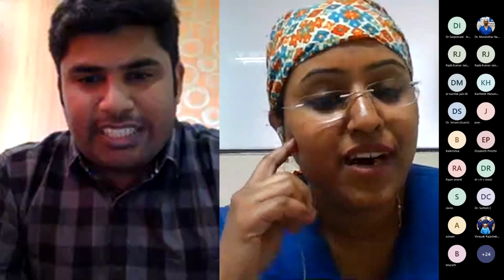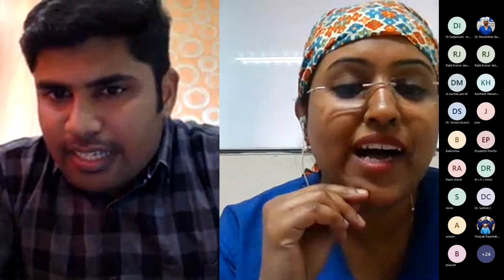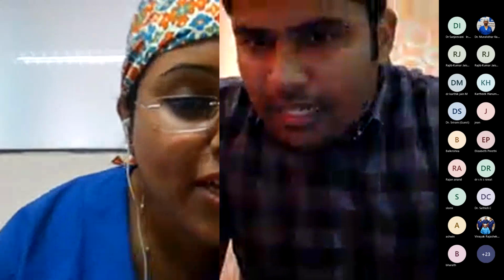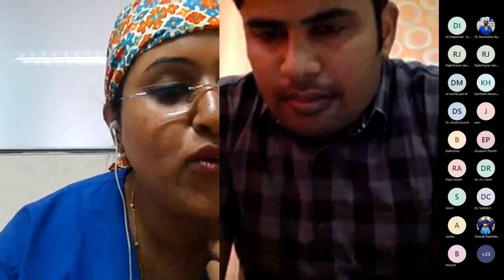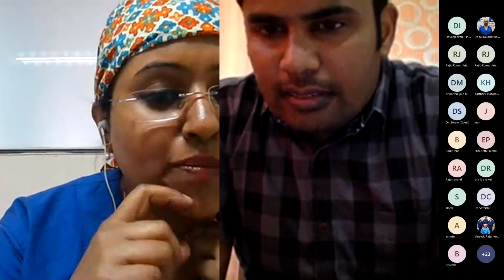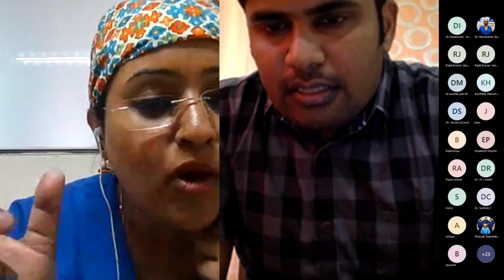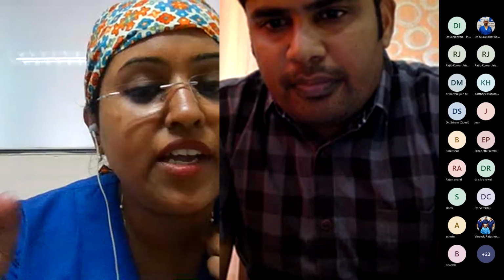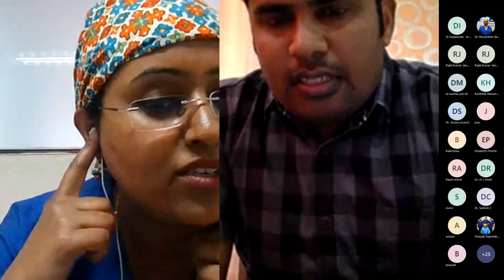Kiruba, I have a doubt regarding tricuspid valve annulus measurements. Sometimes in the four-chamber view we don't get accurate measurements. So can we go to the modified bicaval view or the RV inflow outflow view, or use a biplane method? What is the recommendation?